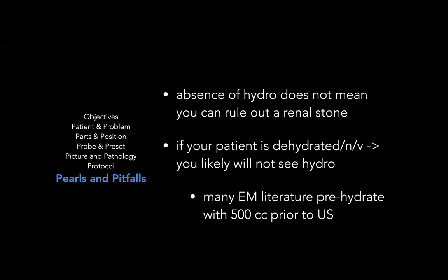And oftentimes in the emergency room settings, patients are hydrated first and then re-scanned again, and then the hydronephrosis, if truly present, will appear. Much of the EM literature says to prehydrate the patient with half a liter before ultrasounding. So just know that as a potential limitation when you're looking for hydronephrosis.